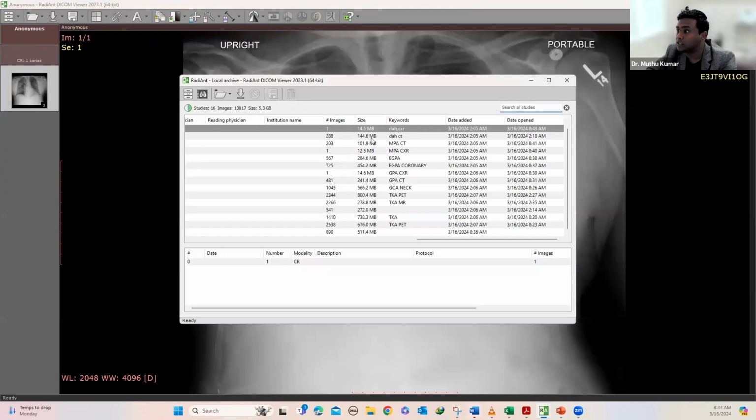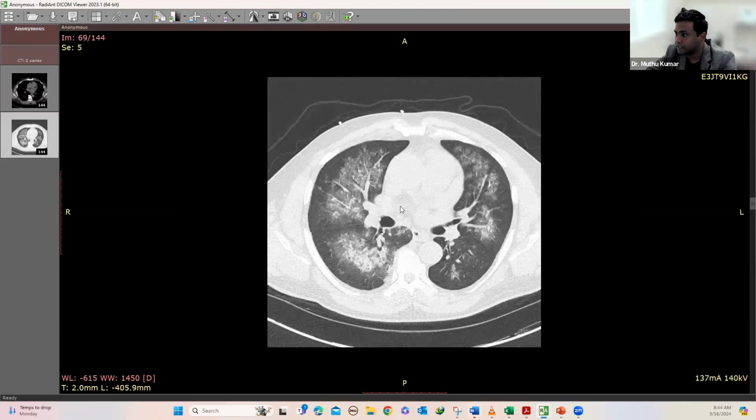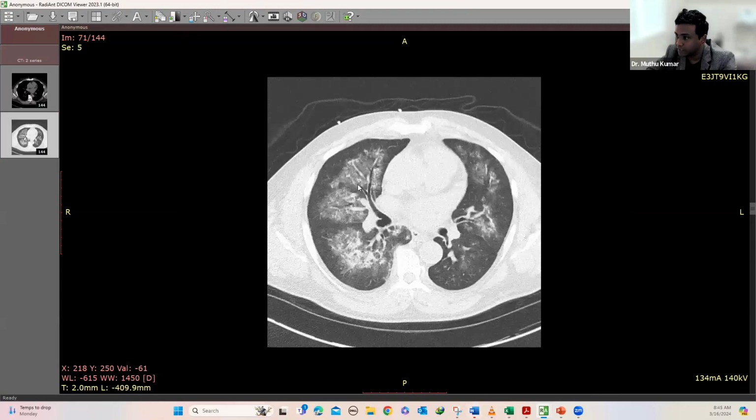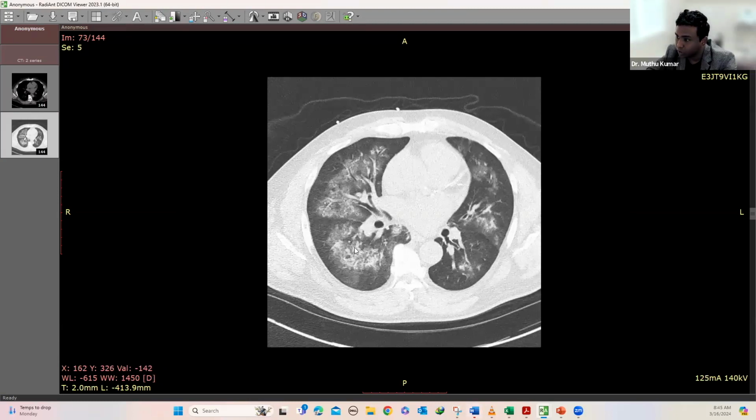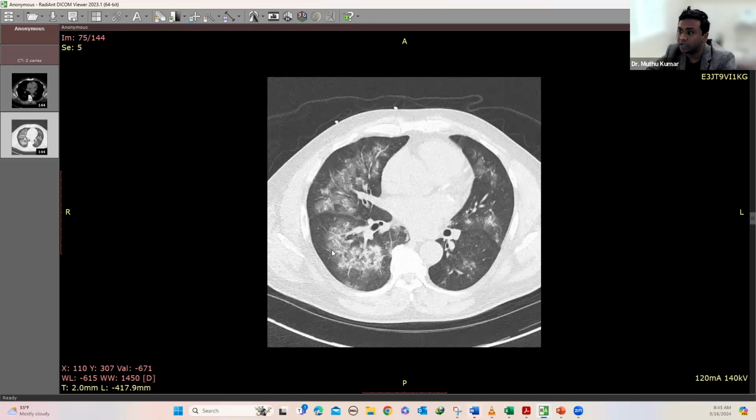This patient underwent a chest CT, and you can clearly see the patient has mild diffuse bronchial wall thickening. There is hazy ground glass opacity, which is ill-defined, and also there are tiny centrilobular nodules. So these tiny centrilobular nodules are the alveolar filling, which, if you cut the patient in cross-section in a histology slide, what you will see is alveoli filled with clumps of blood, as well as the surrounding parenchyma with blood. So these tiny nodules of consolidation are equivalent to blood within the alveoli, and the surrounding hazy ground glass corresponds to blood within the lung parenchyma.